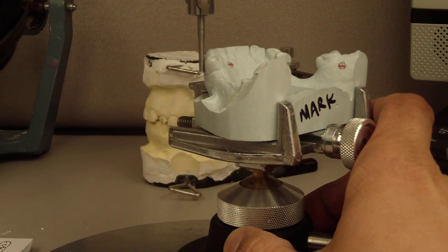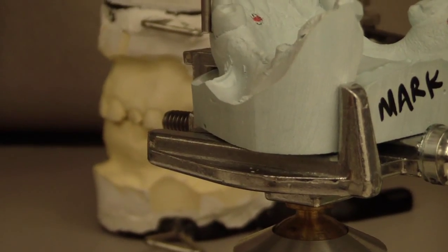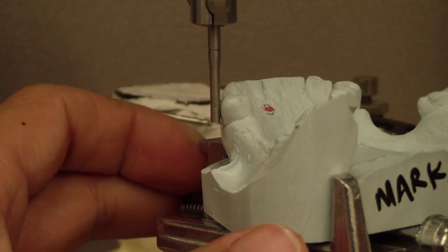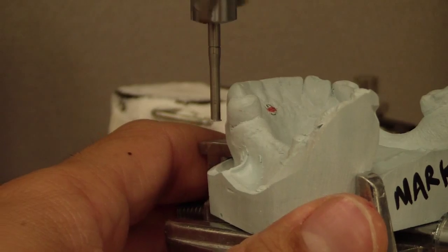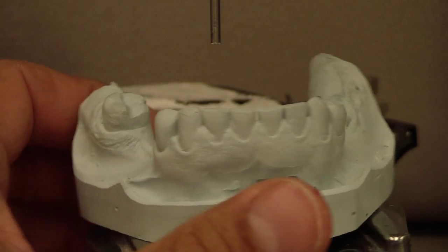So you can see there's my mesiobuccal undercut. Zoom in there on that premolar. So that's a 1/100th of an inch undercut using a circumferential or cast clasp engaging that. I'm not using wrought wire in this situation. And we're not using an I-bar in this situation either.